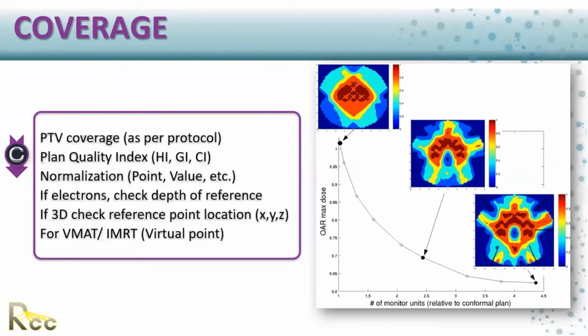The problem with the DVH is that it should be used with caution. The DVH cannot assess the appropriateness of the target and organs at risk. The DVH could report 100% coverage of the PTV, but the prescription dose and the PTV could be delineated incorrectly.